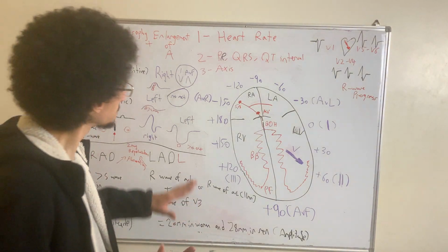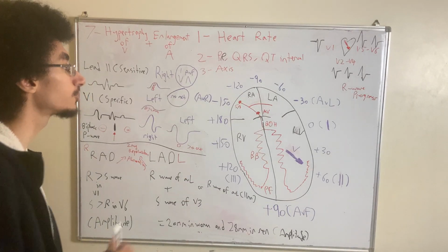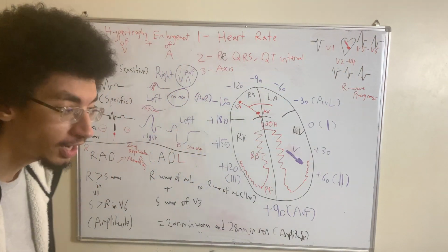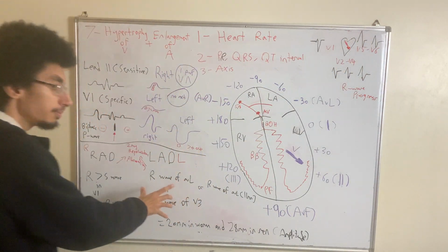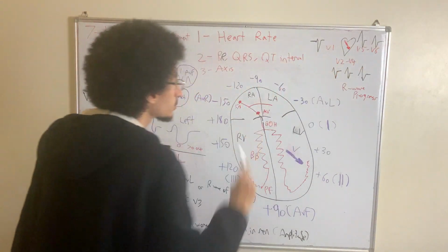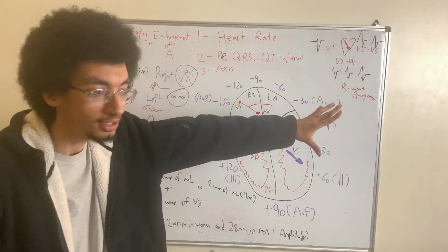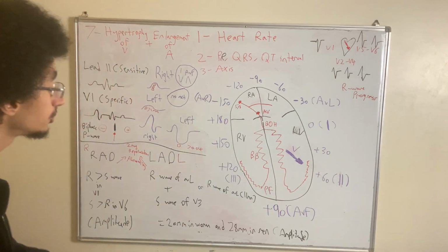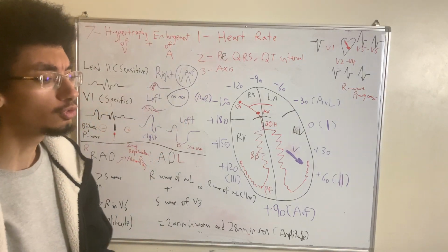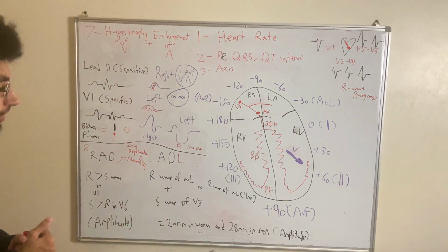Like I said before, the criteria for left ventricular hypertrophy is much more than this. In some cases, you also check whether the R wave in V6 is greater than the R wave in V5. In some cases, you do the same equation, but this time you add the R wave in V6 to the S wave in V1, and you see whether it exceeds 35 millimeters total. So there are many other criteria. But in general, as a rule, to diagnose left ventricular hypertrophy, once you exclude other causes, you look at criteria. The more you have, the more likely the diagnosis.